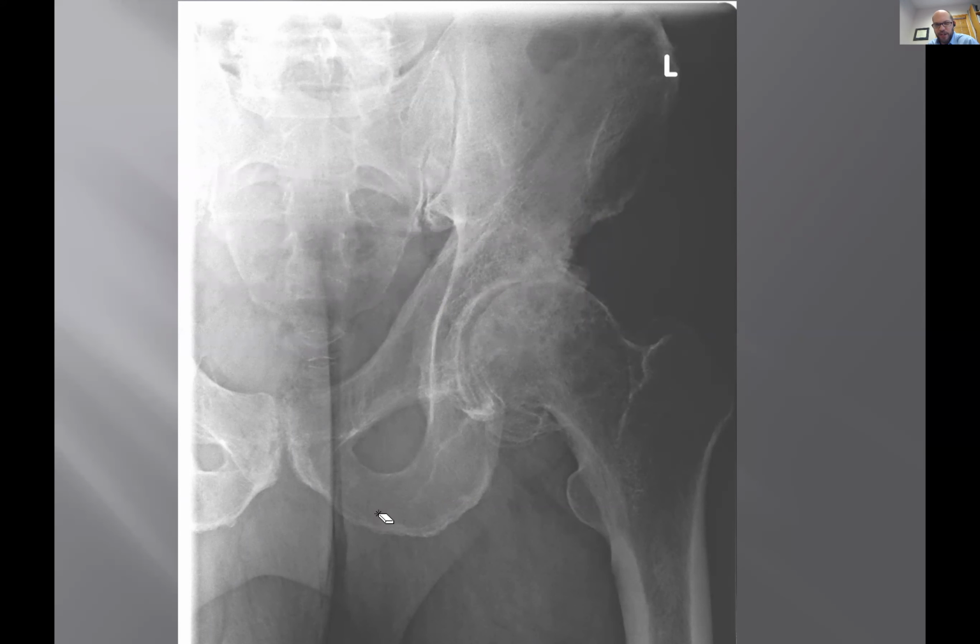Is it true hip pain? Yes or no? Yes. Good. So we're on it, and immediately we want to jump to the diagnosis here. Let me give you a multiple choice: would you go RA, or would you go OA here? 50-50 chance.